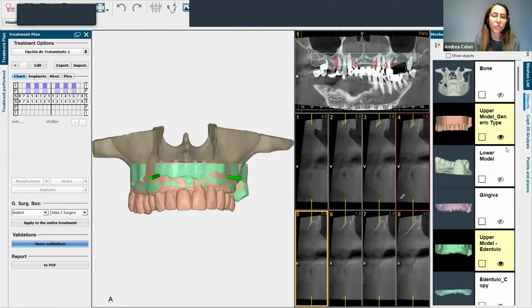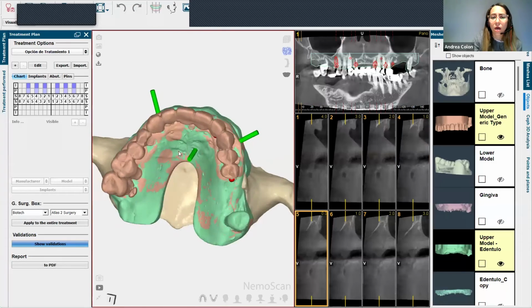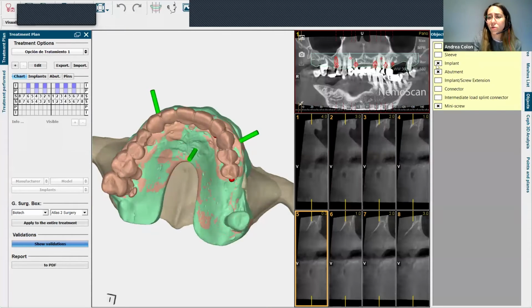to see which kind of treatment plan we did a long time ago, or maybe superimpose any STL or scan body STL with the original planning. You can see discrepancies. You can do a CBCT alignment of the postoperative CBCT with the previous one, and you can evaluate how accurate your plannings are. So maybe that will be interesting also for you.